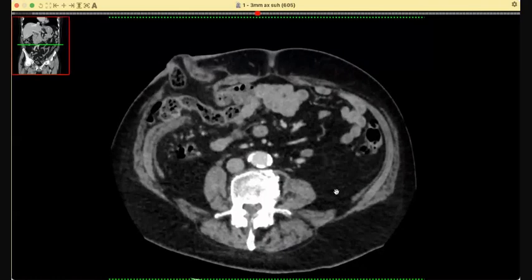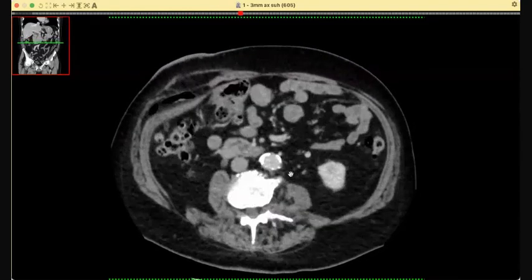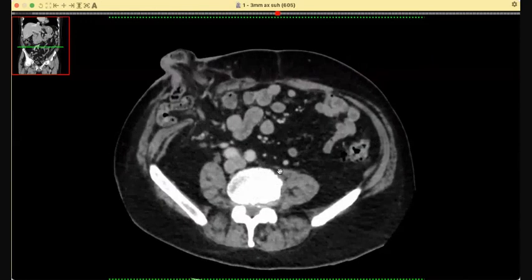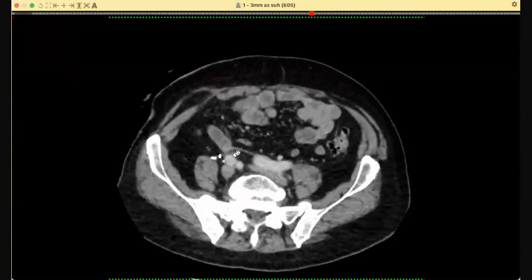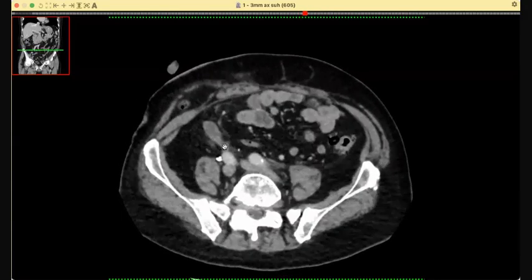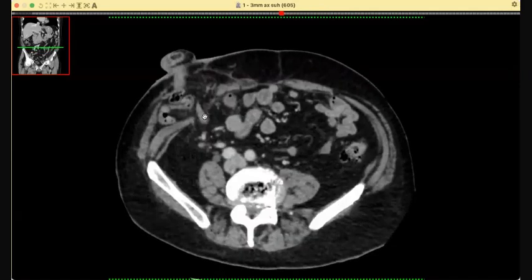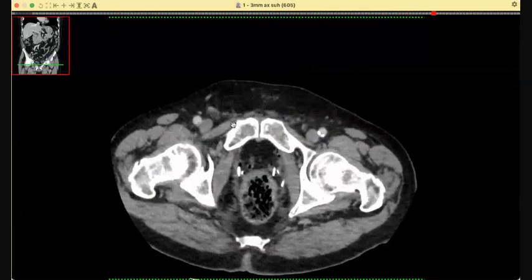Other side. Now, this is the left ureter, and it is collapsed here, and then it crosses the midline. Here you are, this thin line is it. And it goes into this loop here. And ultimately, of course, this loop continues out. So this is the ileal conduit.